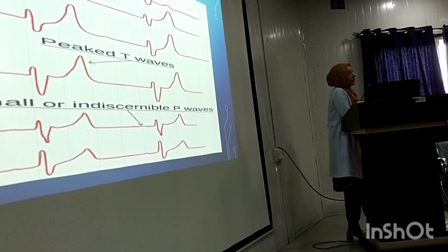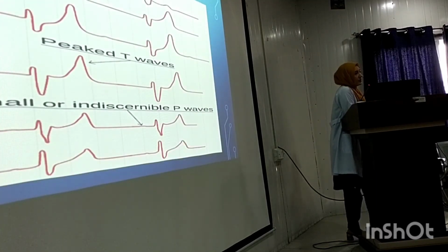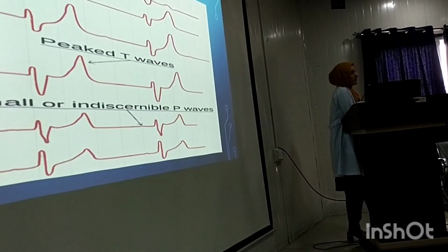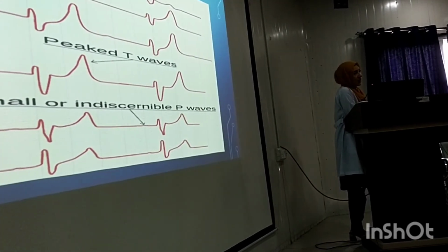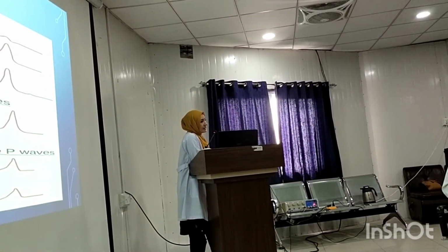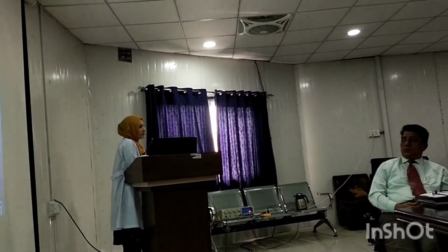Okay, so I put this slide of hyperkalemia because I understand that surgical patients particularly have a lot of electrolyte imbalance, and hyperkalemia is quite common and life threatening. Sometimes if a patient has hyperkalemia with ECG changes, the patient will need hemodialysis to get rid of the extra potassium in the body. So I just wanted to make you familiar by showing you 2 or 3 ECGs of hyperkalemia.